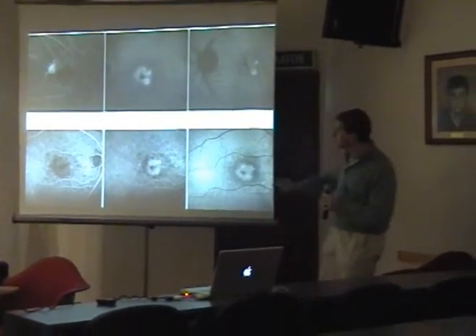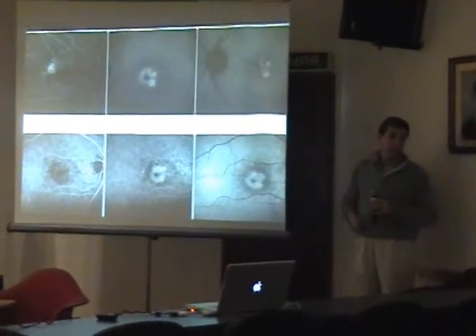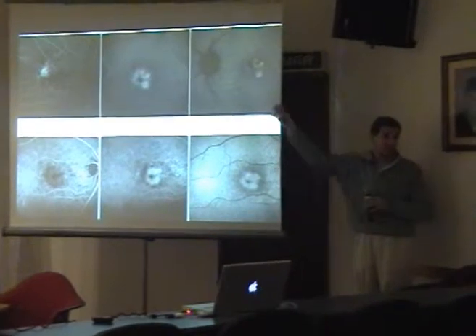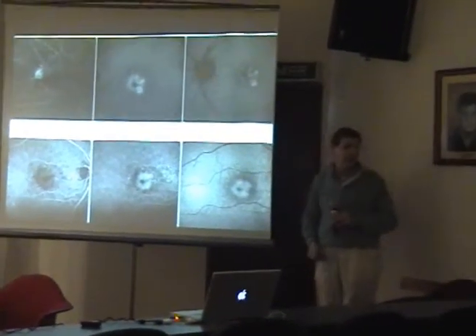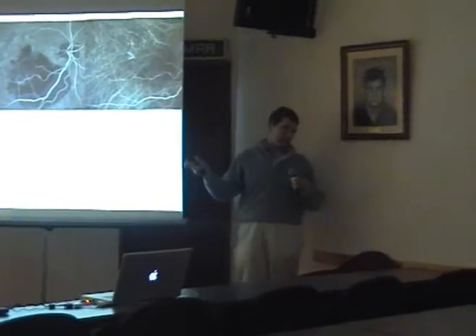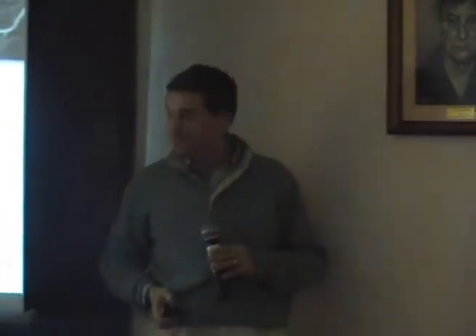But you don't need fluorescein if you do an autofluorescence image before. You have all the information that you want. Why do I have to do an invasive test if I already know that there is an atrophy and there is some lipofuscin there? And this, I think, is the best example of what autofluorescence can give you.